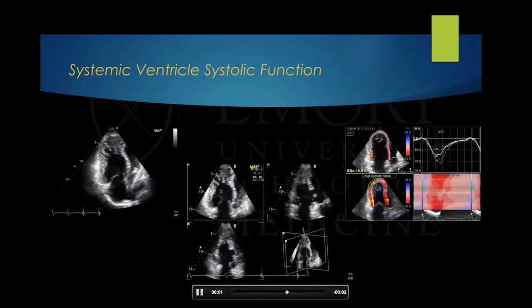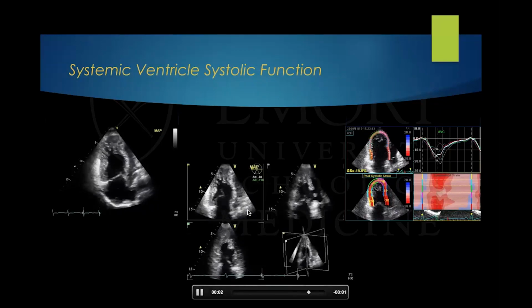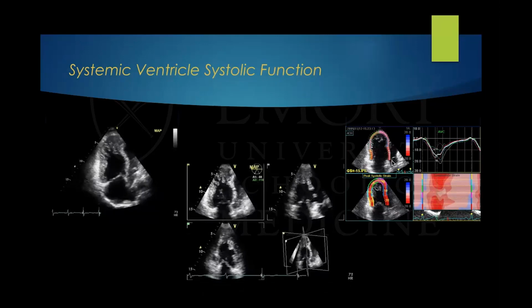So we like to add more information, so we do ventricular strain of these ventricles and we follow the true systolic function. This particular case was preserved, it's 15, which is not the same case as this one. But we've been doing strain for a long time on these ventricles, and we have a cutoff that if the global strain is 10% in the 4-chamber view, that's a poor prognosis for this type of patients.